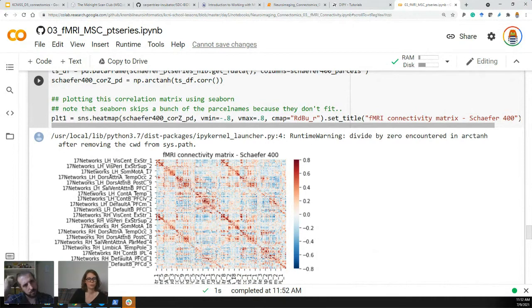Also, we can go back to remember what John was saying about the structure of connectivity matrices we see in functional data. So in this case, we have all of the left regions and their correlations with themselves, and all of the right regions and their correlations with themselves. And then this red line we see here is the off diagonal. This is connectivity across contralateral left-right regions of the cortex. And we can see in functional MRI how some of these contralateral, left-right correlations are actually some of the strongest we get in fMRI matrices.